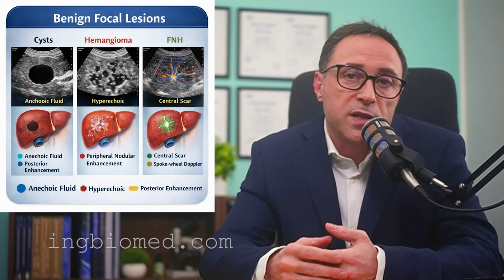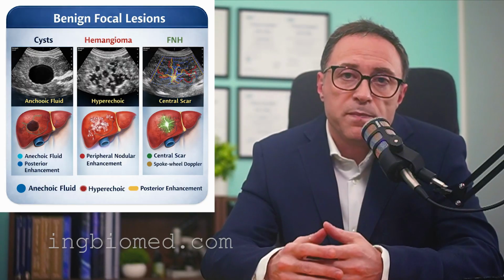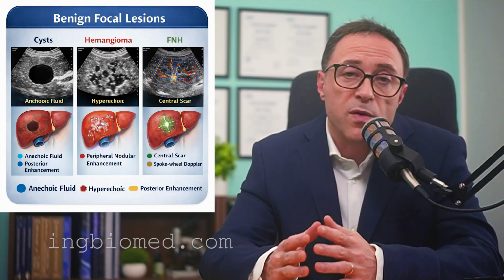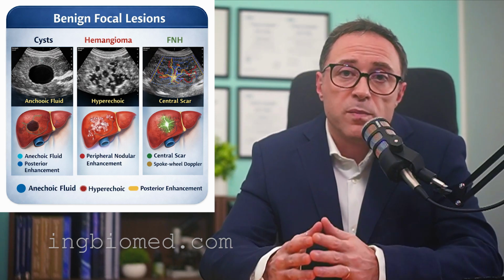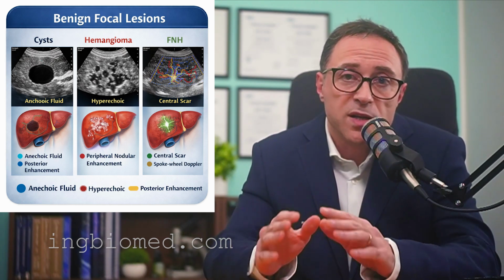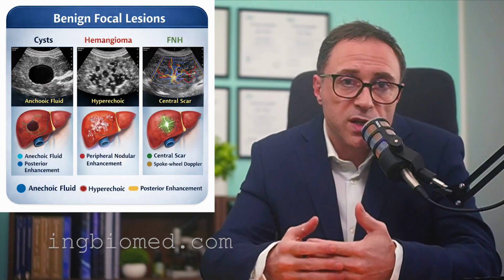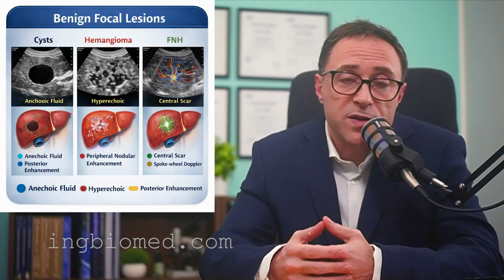Simple hepatic cysts represent common benign focal lesions. Their diagnostic criteria are well established: anechoic content, round or oval shape, thin regular wall, posterior acoustic enhancement, and well-defined margins. Any deviation from this pattern, such as internal echoes or septations, requires further characterization.